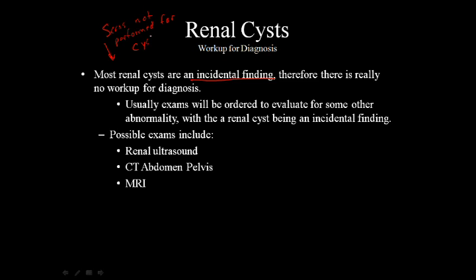So that's something to keep in mind. Usually exams will be ordered to evaluate for some other abnormality, with the renal cyst being an incidental finding. Once again, make a note that incidental findings are usually what cysts fall into.